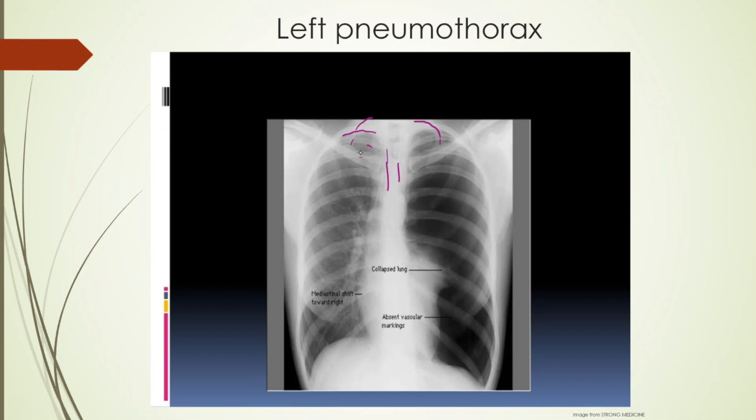So 1, 2, 3, 4, 5, 6, 7. The carina should be between the 5th and 7th vertebral body, so the carina should be between here. And again, if you have your ET tube about the level of the clavicles, you should be okay. But this is another way of determining approximately where the carina is. But anyway, so that's airway. B for bones, we did the bones.